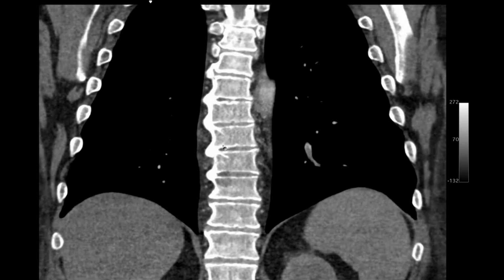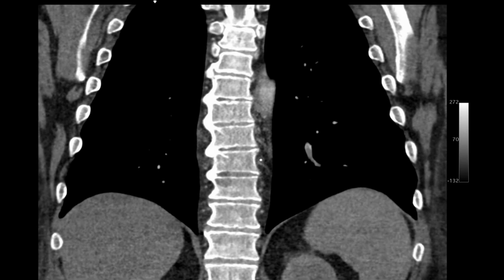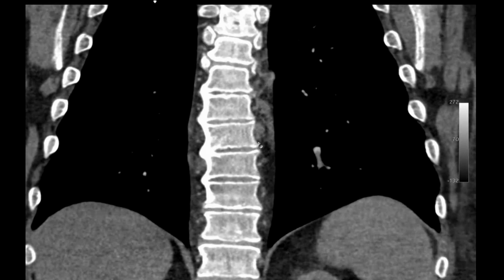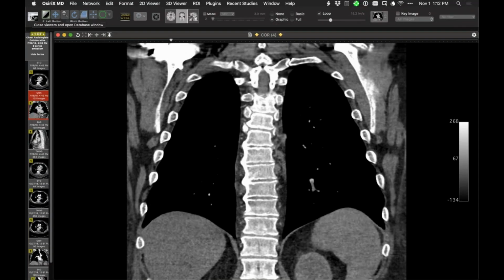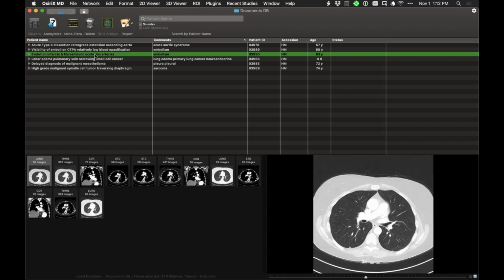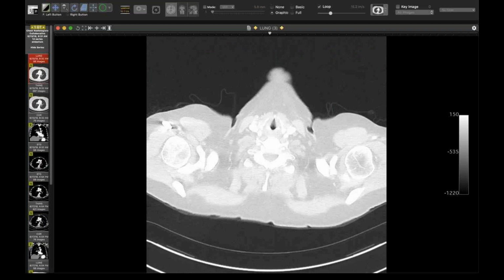It's all about the relationship between the noise and attenuation. It drives me nuts. People are like, oh, it's less than 200, it's non-diagnostic. I'm like, that's nonsense. I'm sorry, Jeff, I interrupted you. It's just one thing that strikes a nerve with me. Yeah, I was agreeing with the same thing, and there really is no basis. If I remember, you only need about a 20 Hounsfield unit difference between the clot and the blood pool to see it.